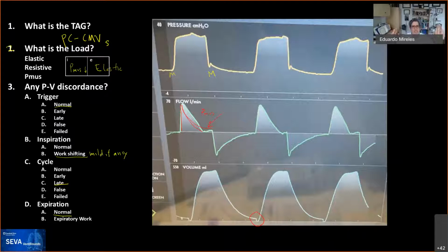What else does it change on your pressure when you give an end inspiratory pause? What does it change on your pressure? Richard Ball just put raising the mean airway pressure. So that's another way. Remember that mean airway pressure equals, in a sense, oxygenation. So the higher the mean airway pressure, the higher the oxygenation. And by prolonging or creating the pause, you improve gas exchange, mainly CO2 clearance, by improving exposure time for gas exchange.